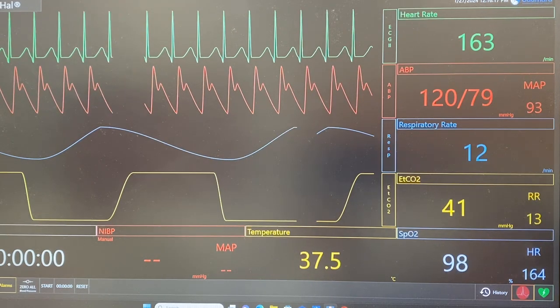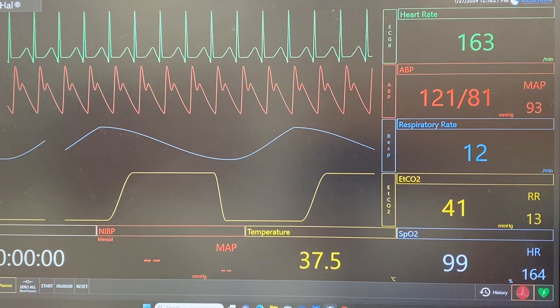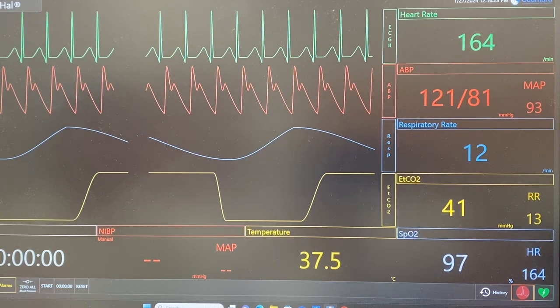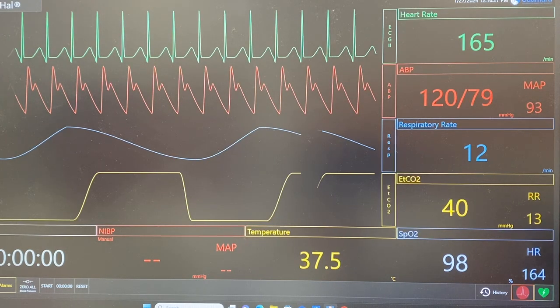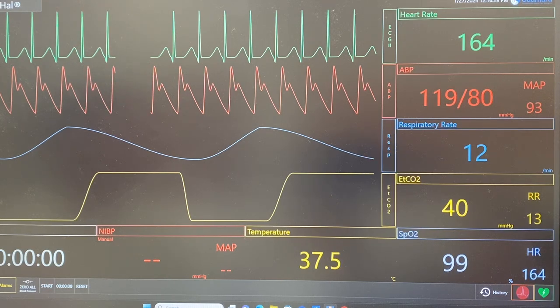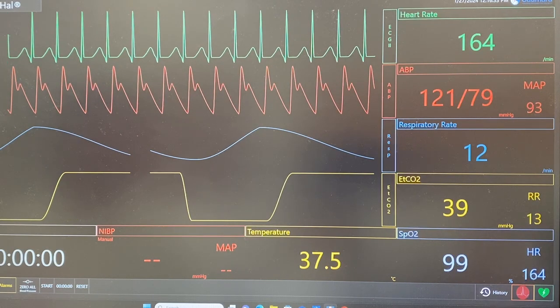Also because of the rate. Usually a sinus tach rate is 120 or less, atrial maybe about 150. This is greater than that, which is why you're not seeing any more P waves.